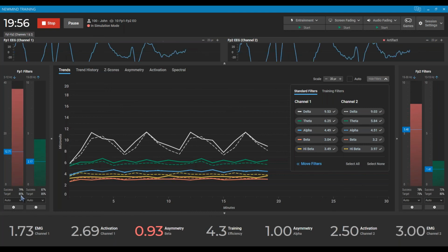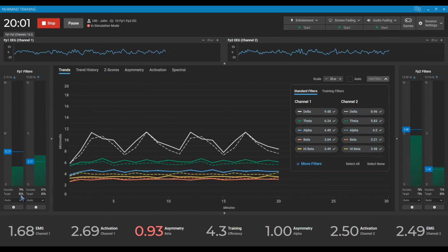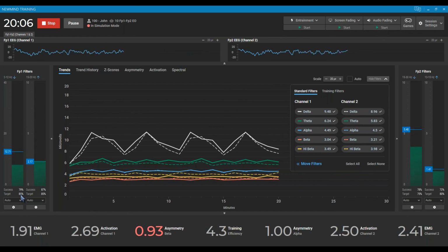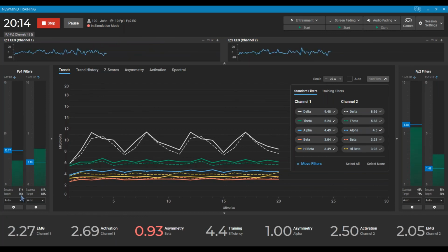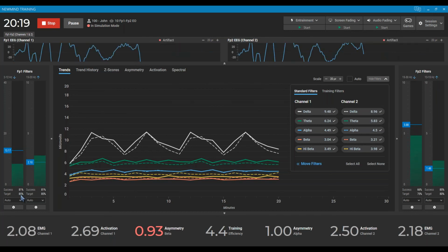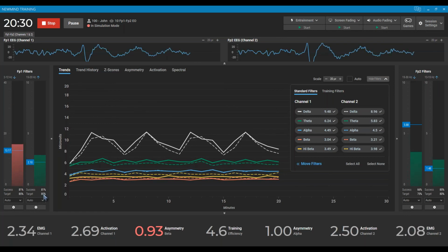You can spend one session with your client, like Rob and I were talking about. I would always recommend doing at least one session as a baseline, maybe starting them like Rob does at 85. That way, you know how their brain's going to respond. And then their second or third session, you can come in and start dialing these target percentages in. And then the software will just remember that.